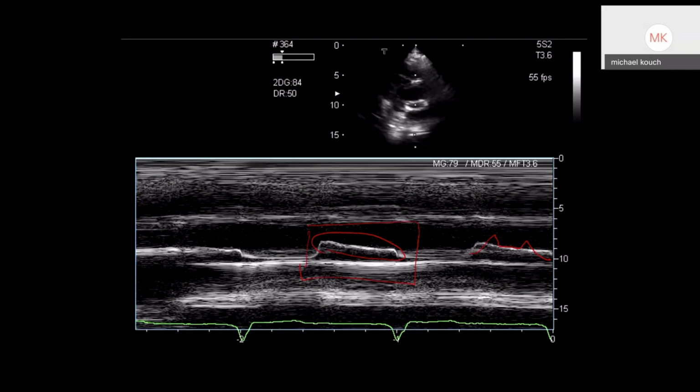Okay, so I'll actually give you an example, and I wish it happened earlier in the day. I would have added to the lecture. We had a gentleman who had a large mitral valve vegetation, who developed acute pulmonary hypertension. Right? We put M mode across the mitral valve, and we see something that looks very similar to this. While he did not have strict mitral stenosis, the vegetation itself formed the same kind of pathophysiologic finding. And that patient developed acute pulmonary hypertension because of acute mitral stenosis because of that vegetation. It was a really interesting case. We can send it out later.